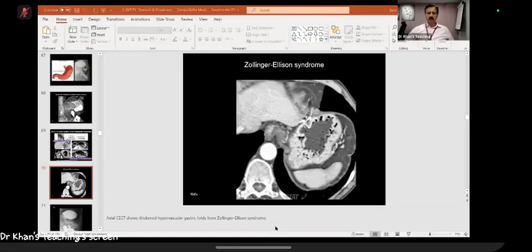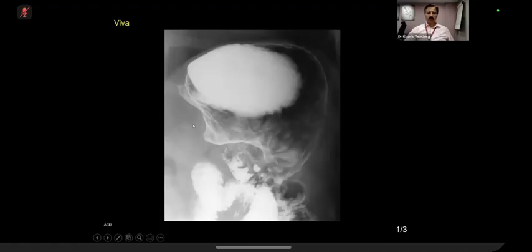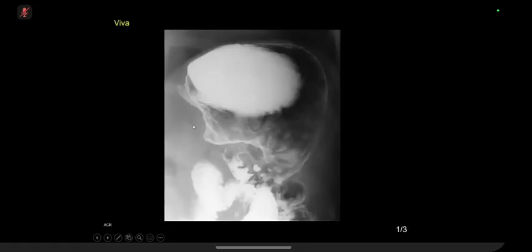So we will come back to our original case. So candidate 9, are you with us? Yes. Okay, over to you. This is a very good film for the exam.